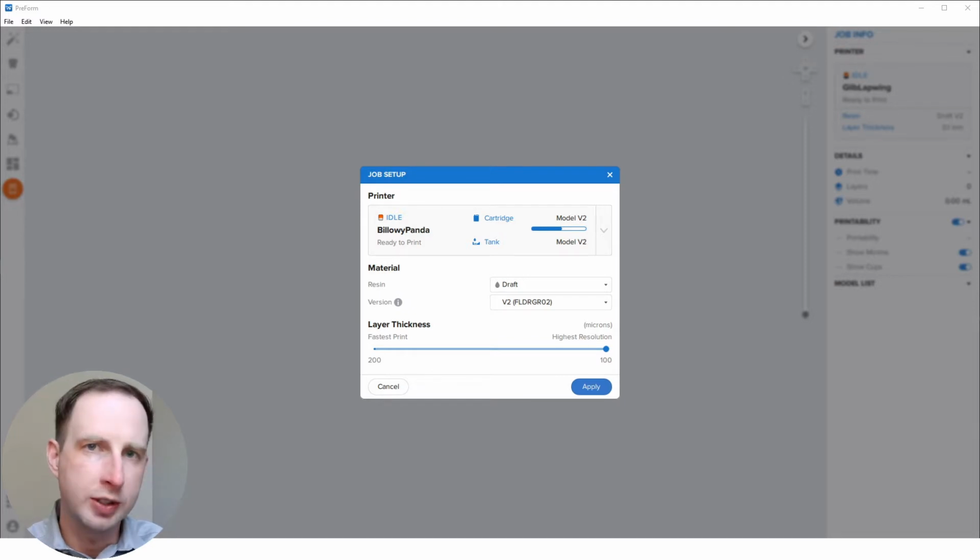The reason I wanted to make this video is because I see a lot of customer files, Form files, where they set things up and they're all over the place or inconsistent, and I hope this video will help with those situations. And good practice before starting.